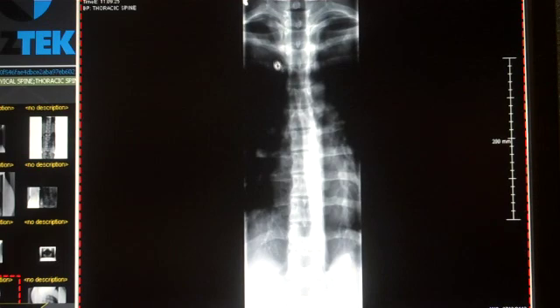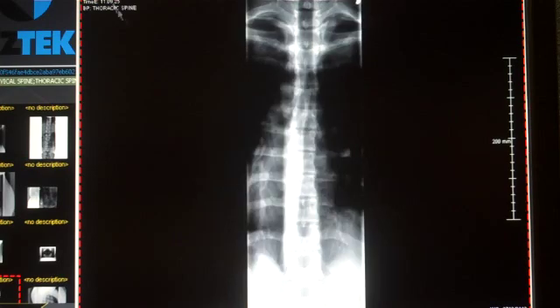You can see, of course, the heart shadow right now. The primary heart shadow is here. Flip it again so I have heart on the left, one third of the heart on the right, two thirds of the heart on the left. We can see where the heart meets the diaphragm, and that again is called the cardiophrenic angle. The cardiophrenic angle on this side is cut off the exposure, and of course I do not see the costophrenic angle. This edge that's coming across right here is the diaphragm, and so where the diaphragm meets the heart is your cardiophrenic angle.